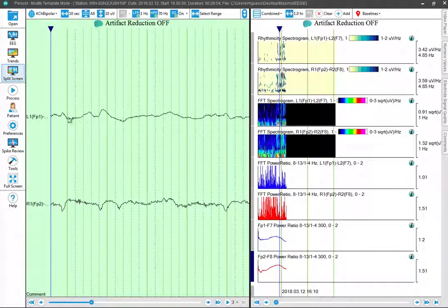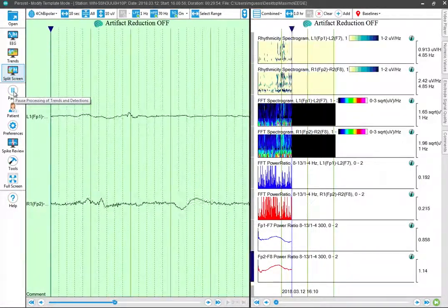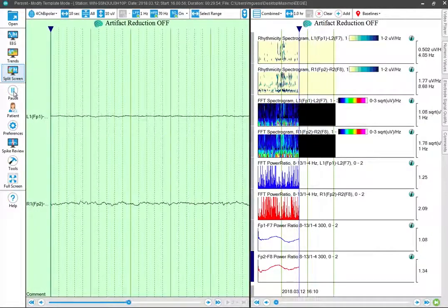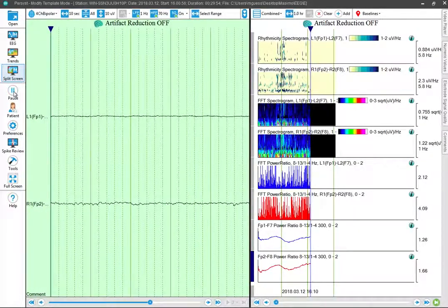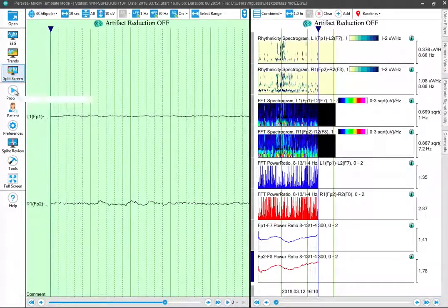And select Process. It'll begin building the average as soon as it has enough data to average, because this is a 5-minute running average that I've created. And so once we've exceeded 5-minute duration into the recording, then that window just slides along with the cursor and averages all those values.